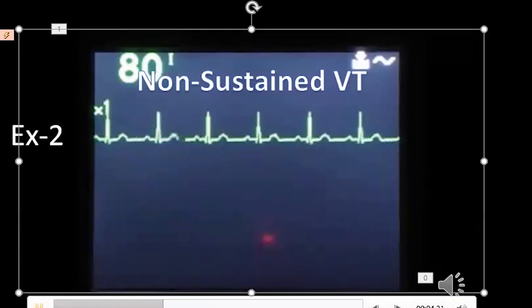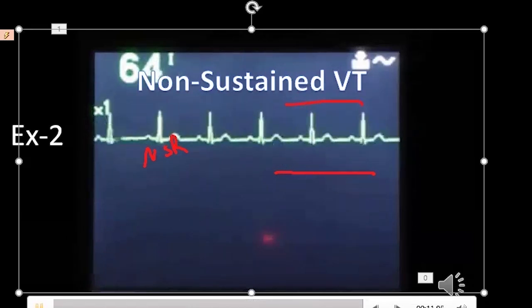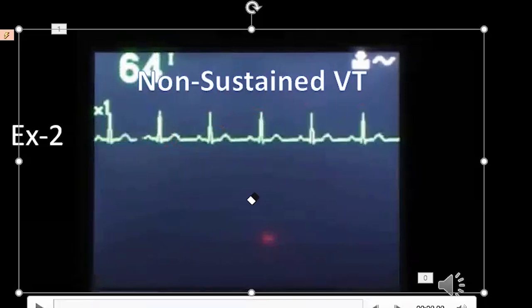You will notice in this video, the initial rhythm is normal sinus rhythm. So here is normal sinus rhythm, and you can see some ventricular beats appear. Let us resume and check. Now you can see these ventricular beats subside on their own, and the rhythm reverts back on its own. So this is non-sustained VT.